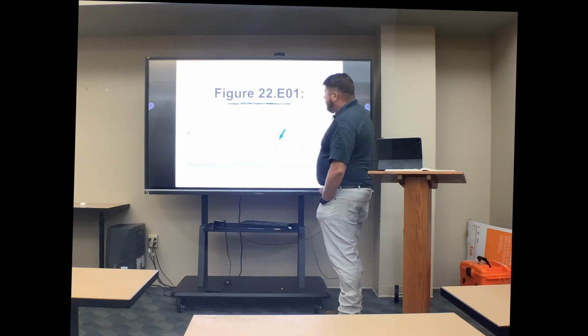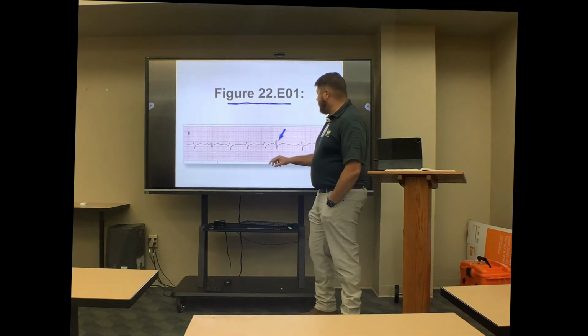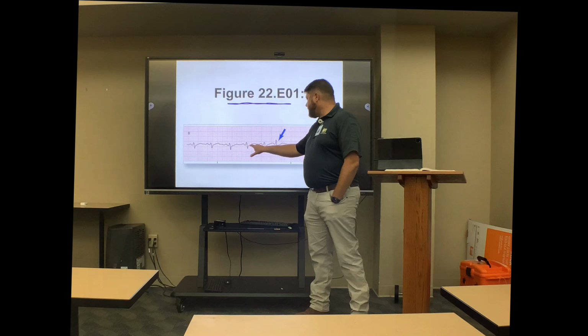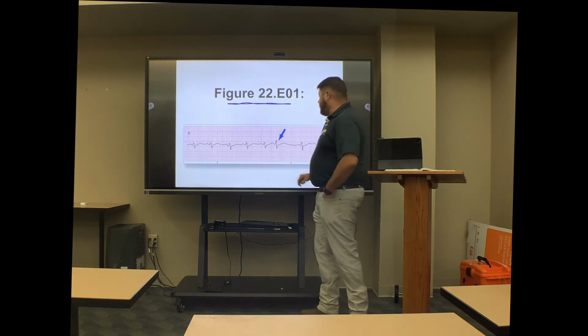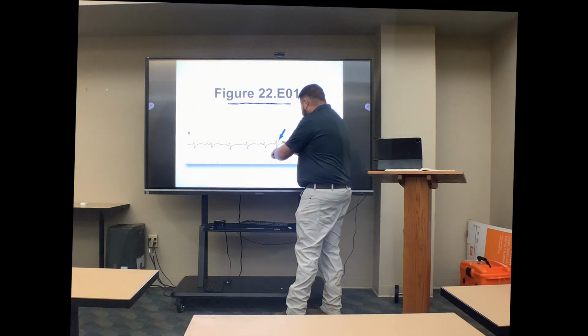Now, one of the things, if you're looking at this, don't get confused, because your P waves all look similar, but then look at this right here. It's very similar in morphology to the T wave, so that's actually the T wave coming off of here. Our next expected beat should have occurred somewhere around in there, but this guy shows up. Hey guys, what's up? Just PJC here.